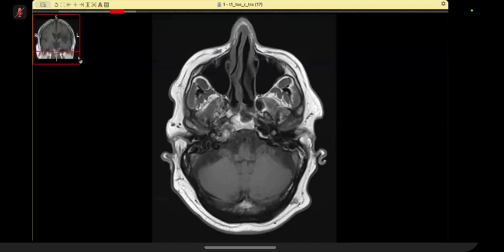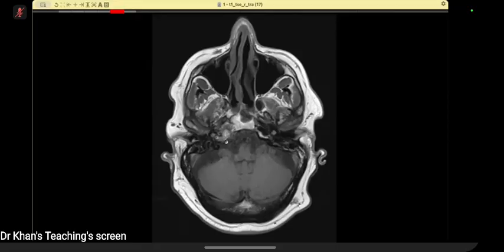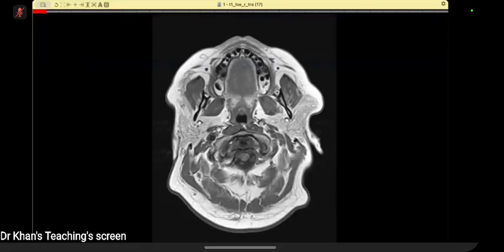Sir, why did you ask for DWI? Sir, I'm thinking of some cholesteatoma in the petrous apex, that's why. What else would you like to do? Sir, no, I'm thinking as the DWI is irrelevant, I would like to see a post contrast. Okay.